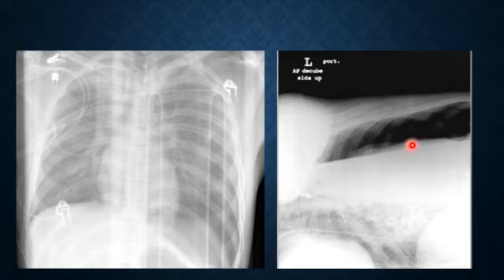Sorry? This one? Yeah, sure. There's a pleural... I did not say hemothorax. I said pleural effusion with pneumothorax. It might be blood, might be pus, might be chyle, might be whatever. There is a fluid and pneumothorax. You can see the air fluid level here.